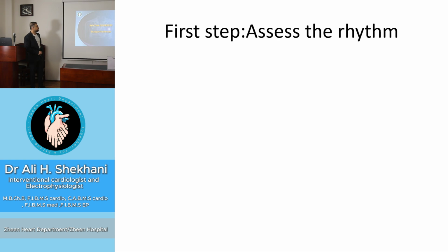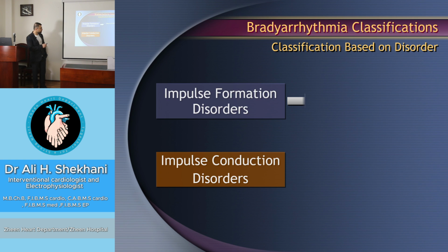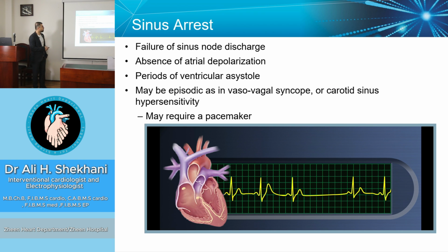First step, assess the rhythm. Let me start with bradyarrhythmia, which is a very common subject. The first thing in the bradyarrhythmia is sinus arrest. The sinus arrest, usually the cause is the failure of the sinus node discharge.